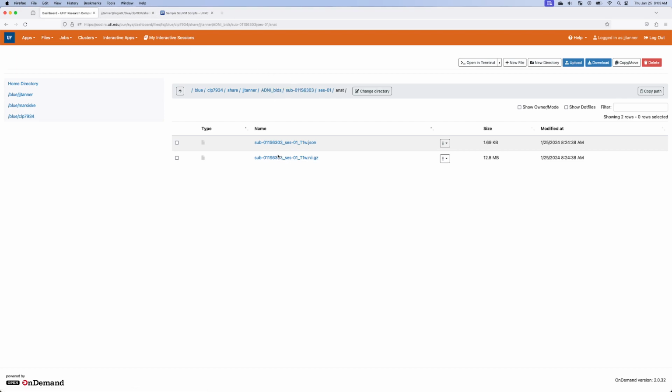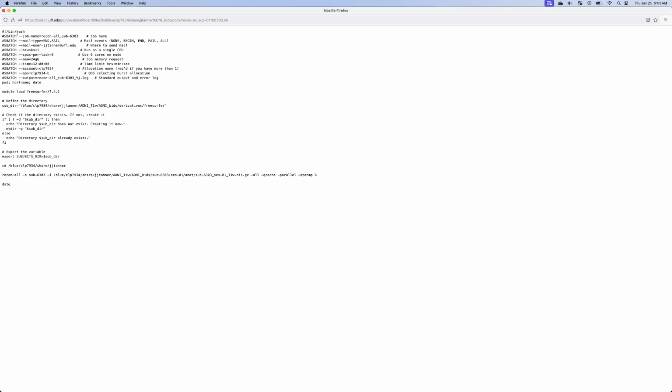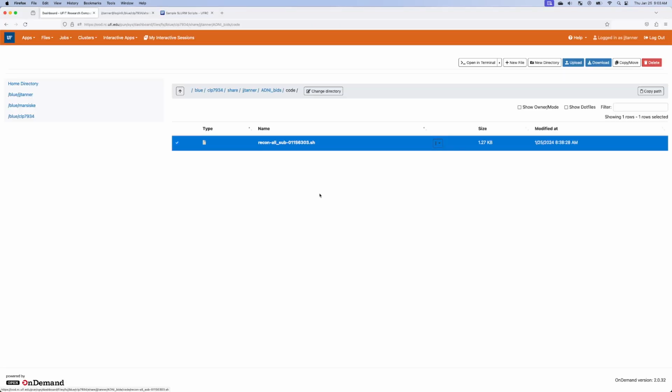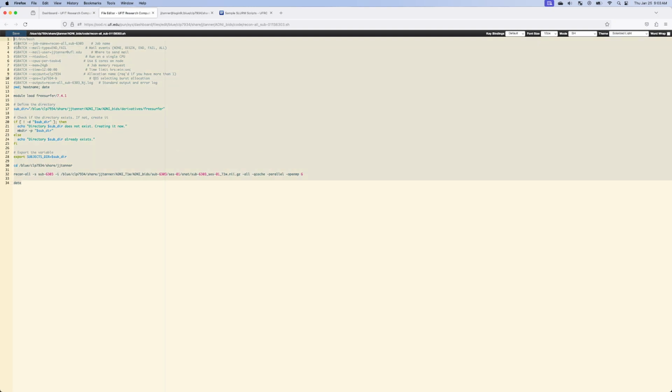In that case, again, I have it in a different window. So it is renamed. I can click on it, and I'm not editing it. I'm just clicking on it, but we see it was not saved. So let me just try editing it one more time in here just to see if this will work. I will paste in my updated one, save it. I didn't get an error, so I'm okay.